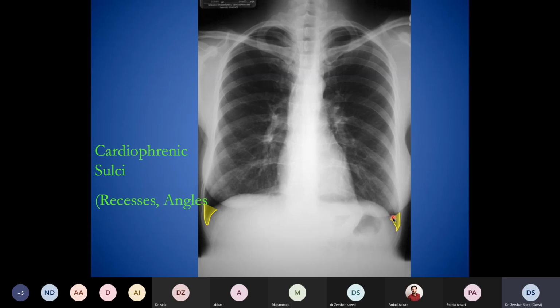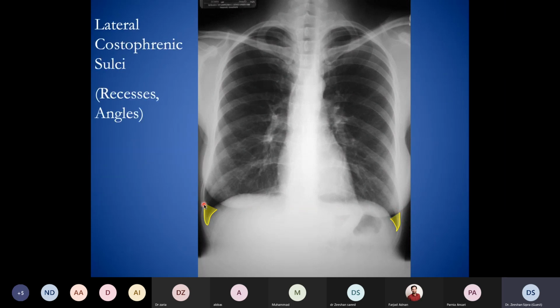But in case of an AP radiograph, when a patient is supine or bed bound, the film is acquired by placing the cassette behind the chest in an AP view. This fluid level would not be seen, but we can see haziness over here. Ideally, this should be black like this, and crisp, and beaking should be appreciated.